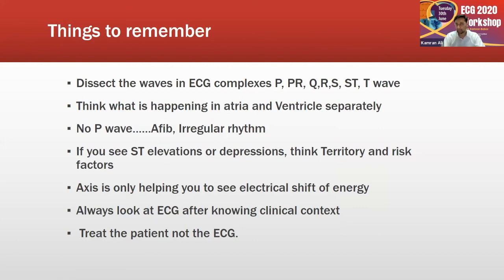If there is LAD, think anterior versus 2, 3, aVF and inferior. And whenever there is an ST elevation and depression at the same time, always focus towards the ST elevation. So axis, the only important thing is that it helps you see the resultant electrical vector in which the electricity is flowing from the atria to the ventricle, and it should be downward and toward the left.